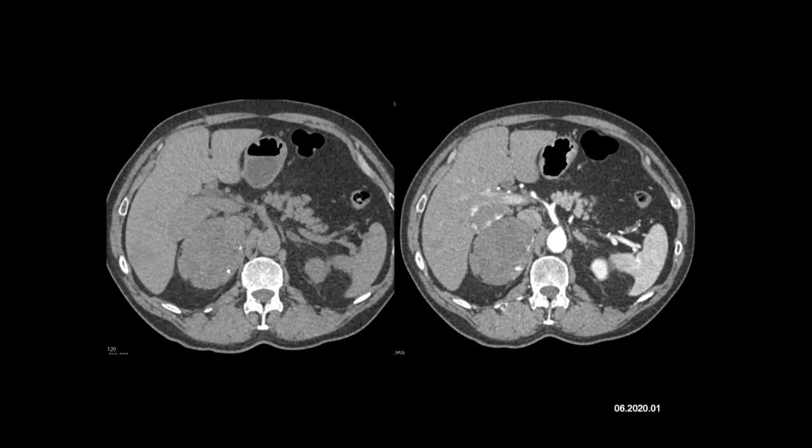Well, okay, myelolipoma is my first guess. Primary adrenal carcinoma? I guess it could be only based on size, but I don't think so. An adrenal adenoma? Gosh, this is big, and I don't know, some enhancement? I would say no. Pheochromocytoma? Sometimes we have big pheos that are not vascular. So I would say the least likely diagnosis was an adenoma.